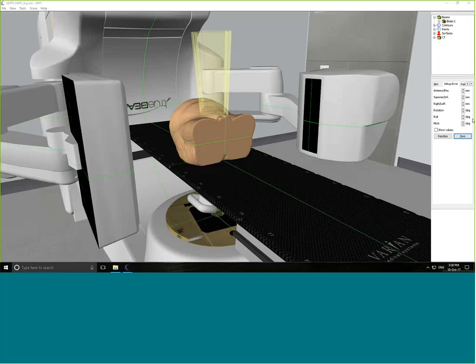What it does is correct slightly for the random error that's created. So in a way, the region of interest box wouldn't have too much say on that correction. Of course, it'd be nice to visualize it, but we don't have that in this feature currently.